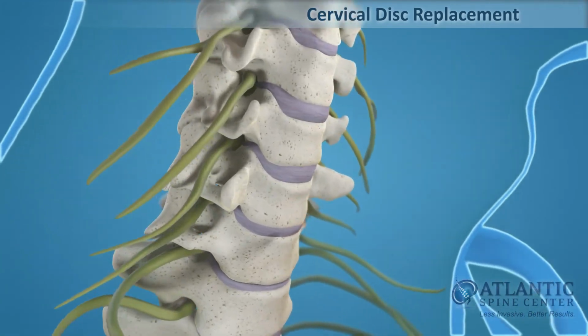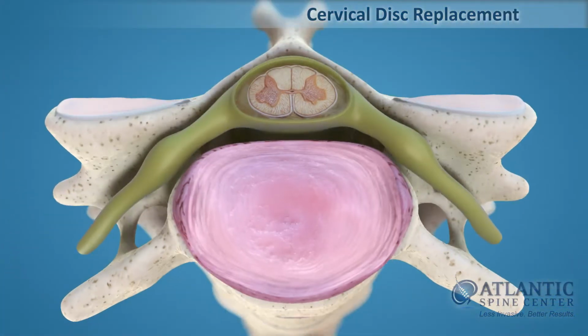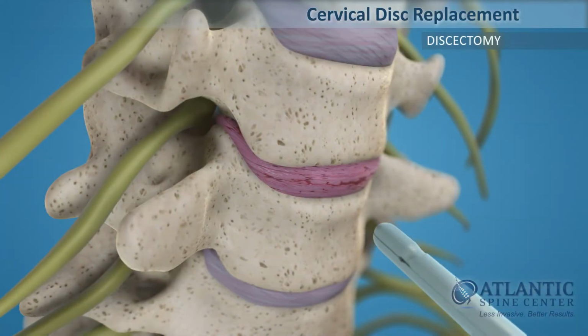Degenerative disease of the cervical intervertebral disc can cause spinal stenosis. Protruding disc tissue can put pressure on the nerves that travel through the spine, which can lead to serious consequences. One of the treatments is cervical disc total replacement with Disc-C implant.